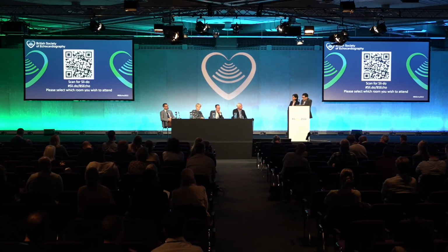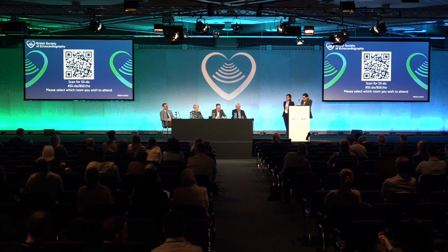Thank you. Question for Liam. If you keep your answers brief, because we're going to run out of time. For projected valve area, what's the incremental value over calcium scoring?